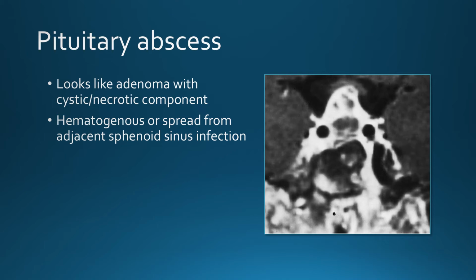This one kind of looks like an adenoma, but it looks very cystic or necrotic. It can be a hematogenous infection or spread from the adjacent sphenoid sinus, but it's quite an uncommon entity.